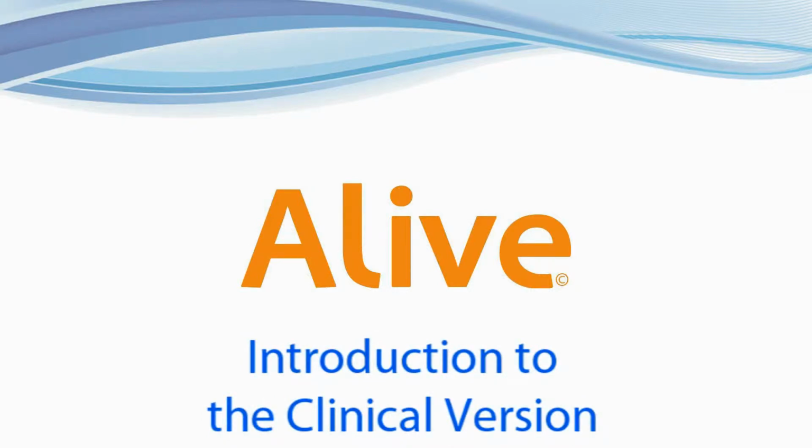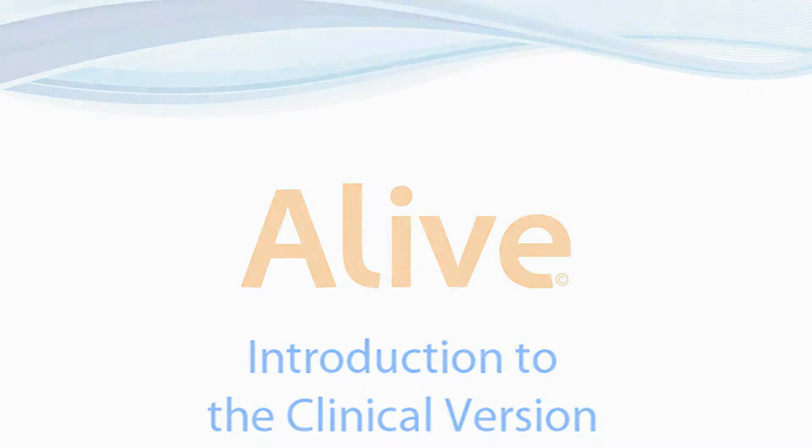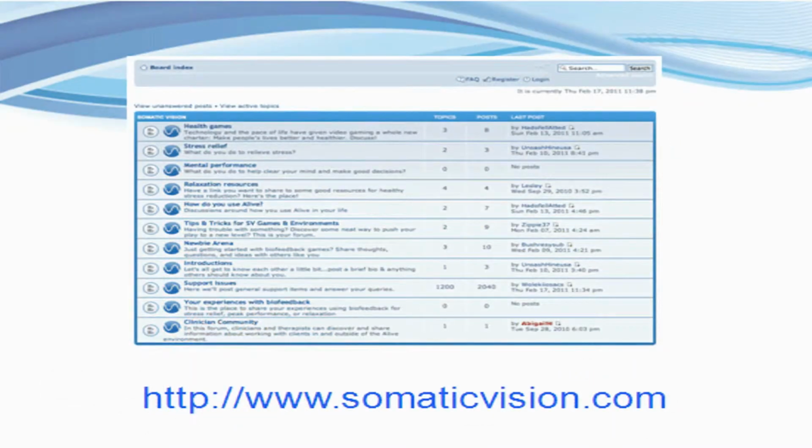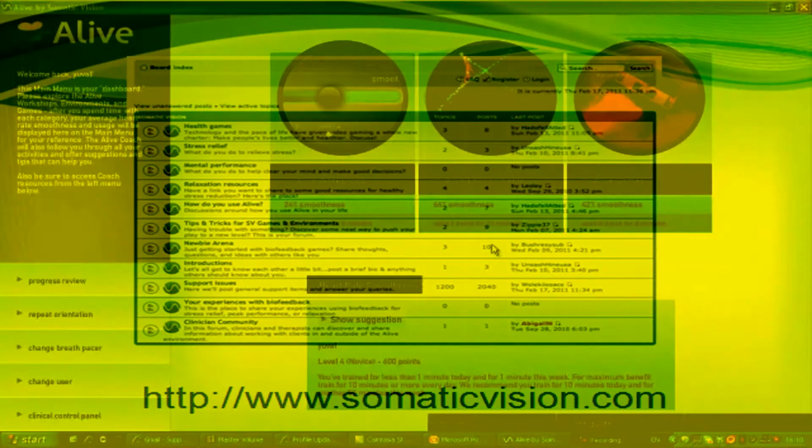This video was made to introduce you to the many robust graphing options we offer in support of your work with patients. Most likely you've worked with biofeedback training before and have already used the standard version of Alive. If you have not and need further clarification on anything you see in this video, we invite you to visit our forum at somaticvision.com and ask any questions you may have.